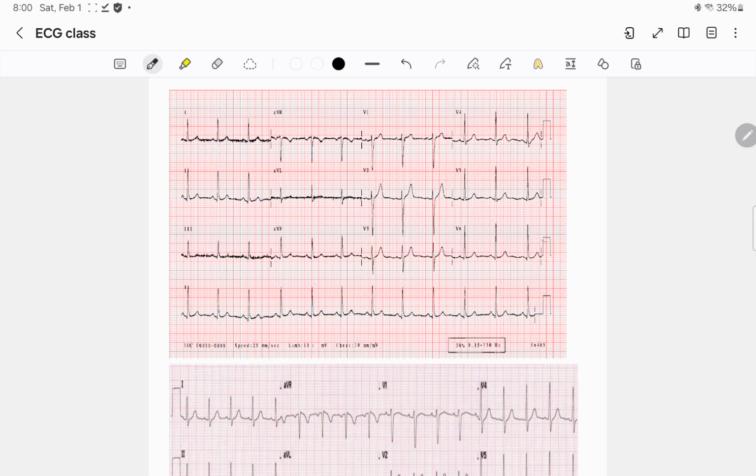In lead 1, we can use our thumbs. Lead 1 is our left thumb, AVF is our right thumb. Lead 1 is positive, so thumbs up, and lead AVF is positive, which is a thumbs up as well. So two thumbs up, that's a normal axis. Now we're going to look at the waves, segments, and intervals. We haven't gone into great detail about the P waves in terms of chamber enlargement, but we're going to look grossly at V1 and lead 2, and these are grossly normal P waves.